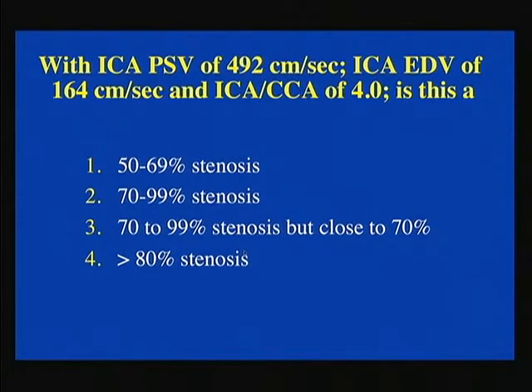Well, that's a bit tricky. I told you that common carotid artery velocity is going to come back and hurt us. So which one is it? Well, if you use 492, and potentially in combination with this, you're probably safe using this. Okay, so this would be perfectly acceptable.